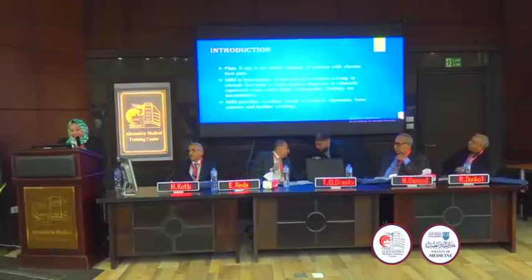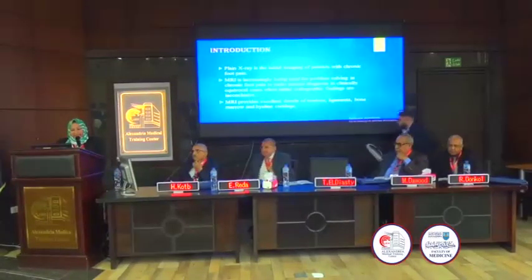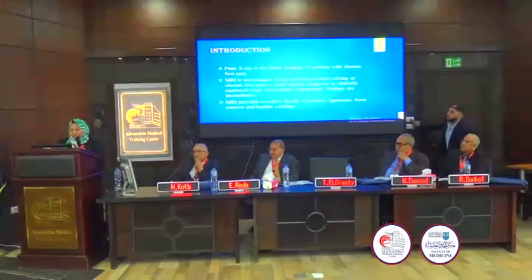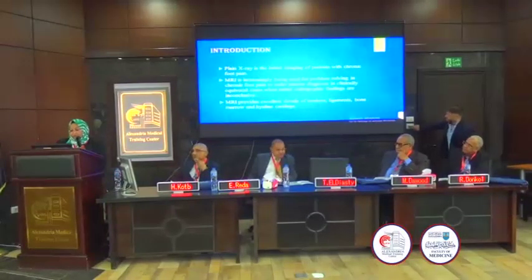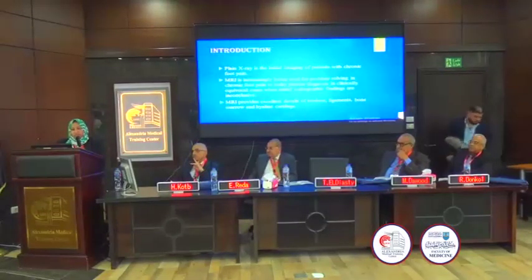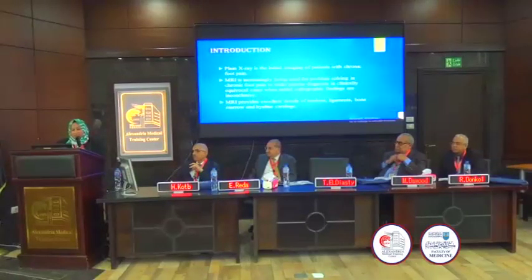Plain X-ray, of course, will be the initial imaging modality used for patients with chronic foot pain, as in all musculoskeletal conditions. And MRI is increasingly used for problem solving in chronic foot pain to make a precise diagnosis in equivocal cases when initial radiographs are inconclusive. MRI will provide excellent details about the soft tissue and osseous structures, as we will see.